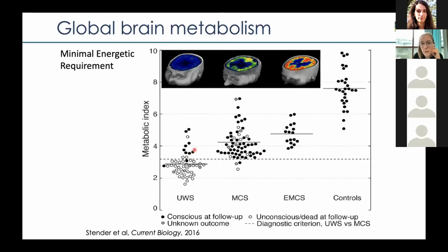So here we have some patients in the unresponsive group, and they actually have a higher glucose uptake. And indeed, these patients actually did recover consciousness at follow-up. And for the patients in the MCS group that had a glucose uptake below threshold, they also usually had a worse outcome.